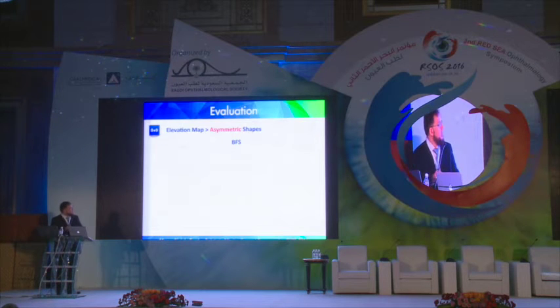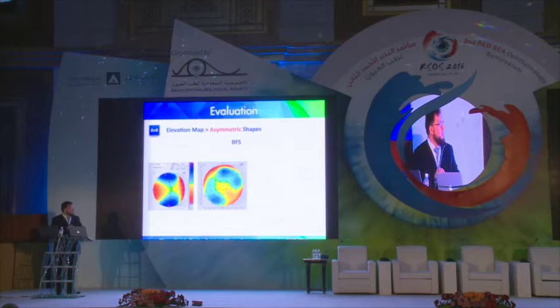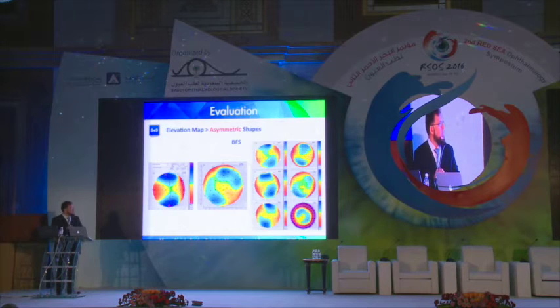Asymmetric shapes, we have the skewed, but there is no definite number. It is not like the curvature map. We cannot say that if the skew is above 22 or below 22. Tongue-like extension and irregular hourglass.